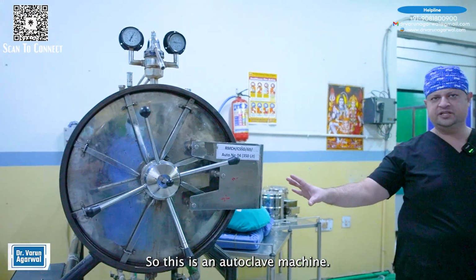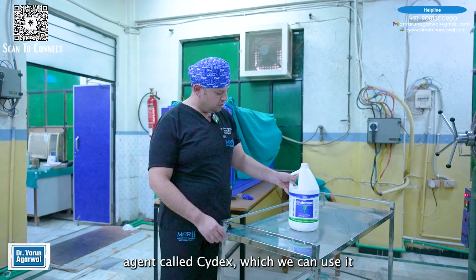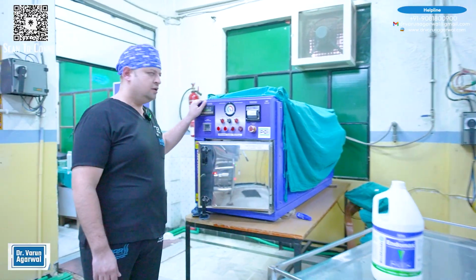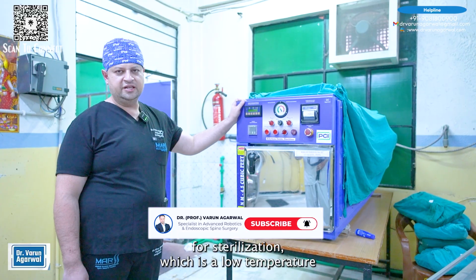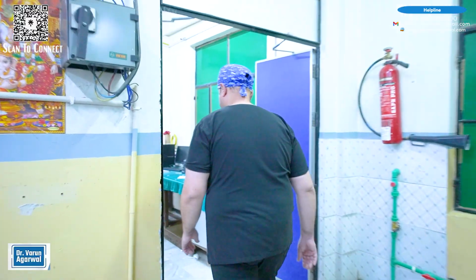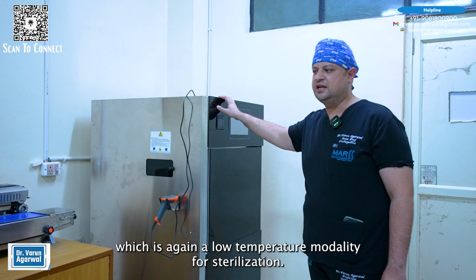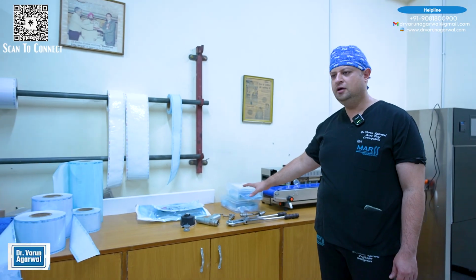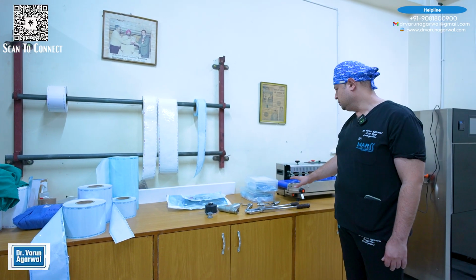So this is an autoclave machine. This is a chemical agent called Cydex, which we can use for quick sterilization. Another machine is ETO, which uses ethylene oxide for sterilization, which is a low temperature sterilization modality. This is the plasma machine, which is again a low temperature modality for sterilization. And this is the setup which we use for peel packing the instruments for either autoclaving, ETO or plasma.